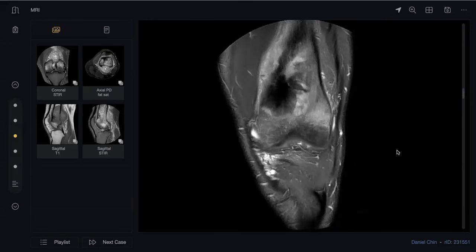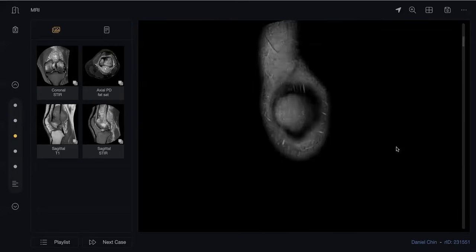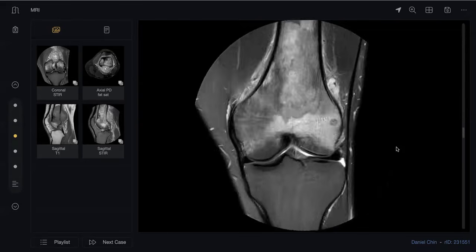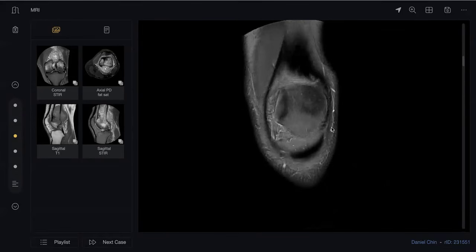In my daily practice, I want to see post-contrast images to see enhancement of the soft tissue component. No other lesion can be identified. There is cortical destruction and cortical thinning under the soft tissue component, and also the Codman triangle. This confirms the diagnosis of osteosarcoma. I will urgently refer the patient to a sarcoma center for biopsy.